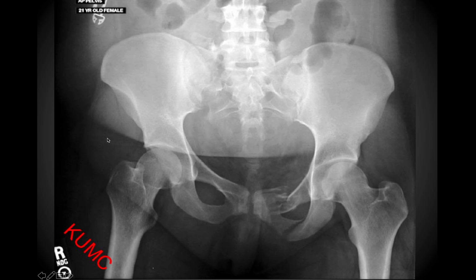Okay, this video is going to go over a lot of the bony aspects of the pelvis. So we're going to start out by looking at an example of a pelvic fracture here. You'll notice, again, the first thing that you want to be doing is looking at the left to right symmetry between the pelvic inlet here and then also each of the obturator foramina.